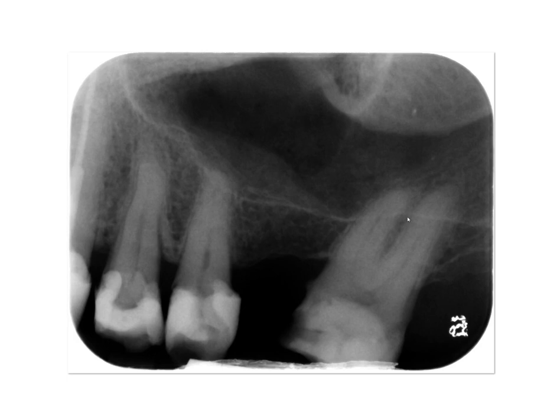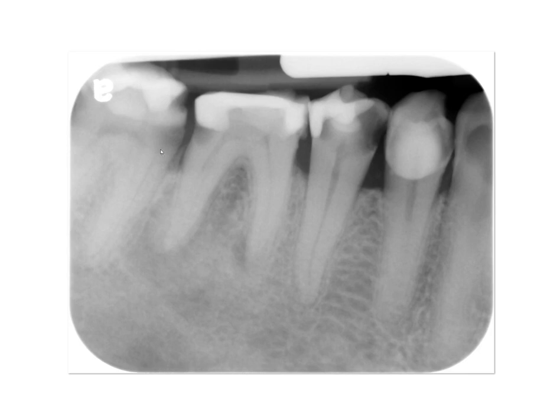Here's the floor of the maxillary sinus, and this one is great because do you see this U-J-shaped opacity? This is the zygomatic process of maxilla, and then the rest of this opacity that's extending posteriorly represents the zygoma. So in the previous radiograph, we probably saw the zygomatic process of maxilla and part of the inferior portion of the zygomatic bone.